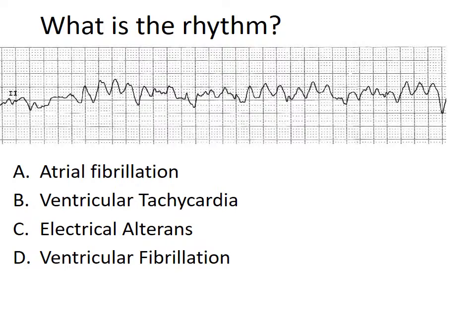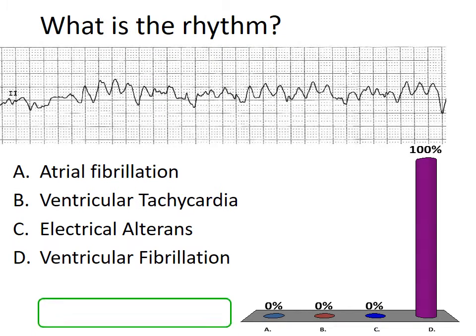What's the rhythm here? A whole lot of badness, but there's no true defined PQRST stuff. No QRS complexes. It's not discernible. You can't tell one beat to the next what's going to happen. It's all different, and it's kind of just fibrillating, right? So, VFib.